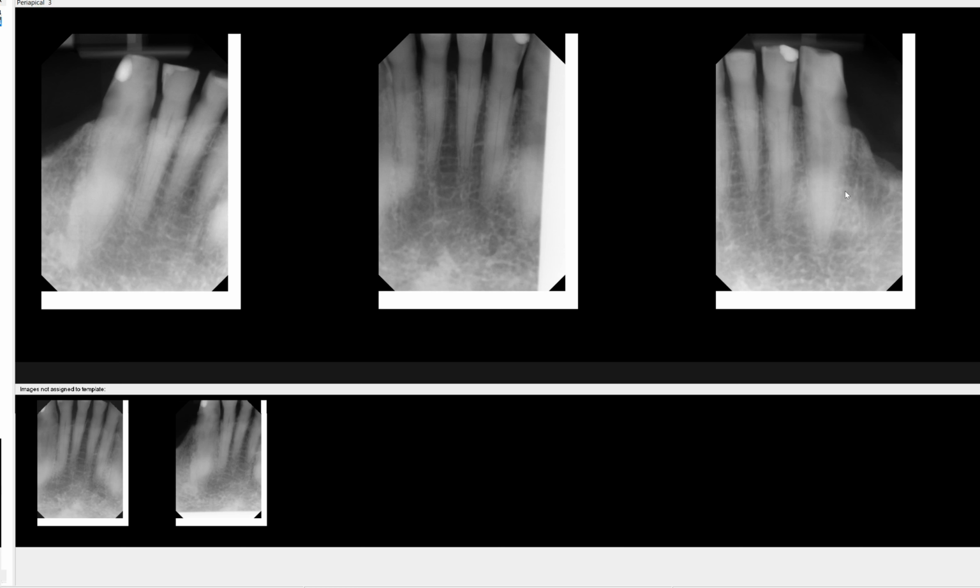And from my experience, these questions often show up on board radiographs or board questions, so I strongly encourage everyone to be familiar with the appearance of mandibular tori.